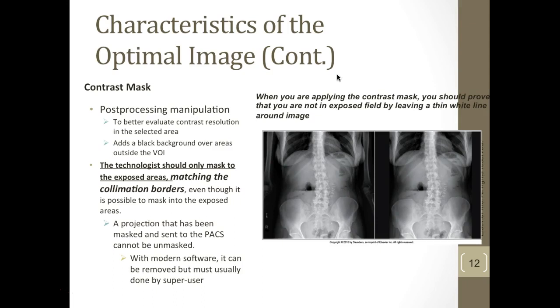I left this in here because really, when you apply a contrast mask, it helps with the contrast resolution in the selected area. So this will be one of your quiz questions. It does help with the contrast resolution in an area that doesn't have it. So it adds a black background outside of the VOI, which is great.